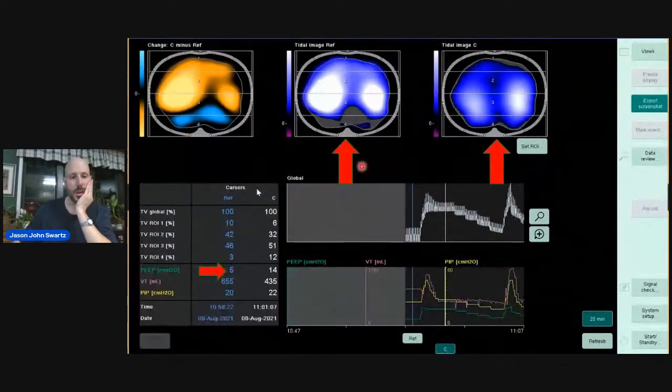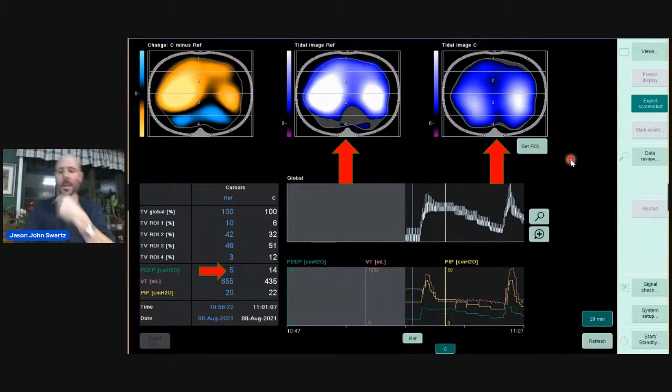There's a lot more that we can pull out here. I'm doing a quick little presentation because I'd like to show you the case that I did, and I don't want to be too long.